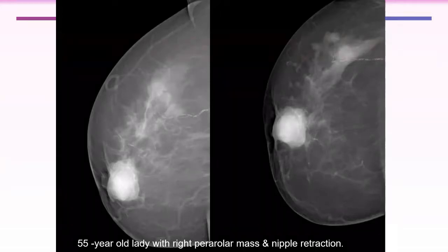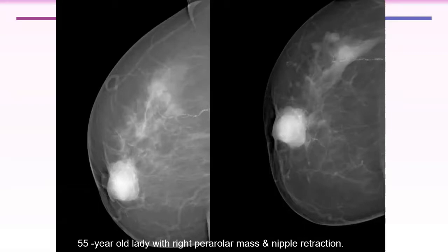But the rest of the skin is unremarkable. Focal nipple-areolar complex thickening and retraction. What else? No abnormal calcification. No obvious calcification. Okay. What else? Any other abnormality, or only this one?